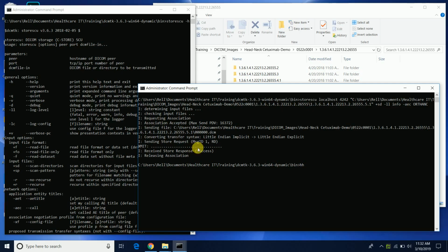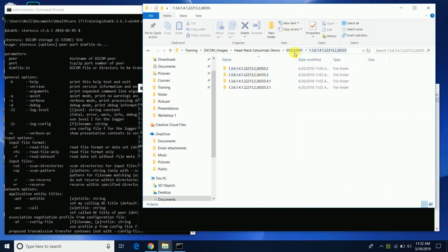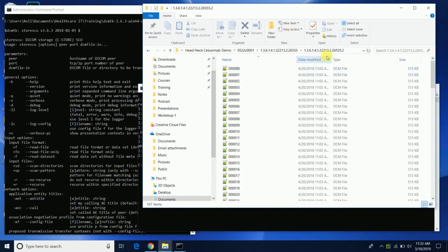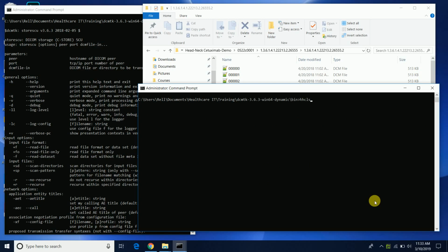Now, if we wanted to send another series, in the same study, we'll just copy that location. Let's just clear screen. All right, we'll come back here.